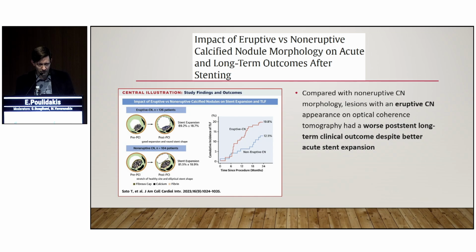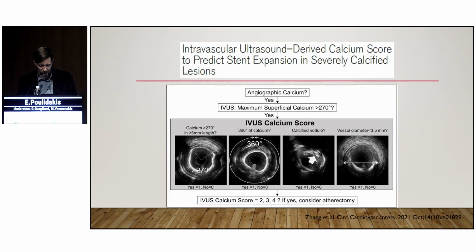Speaking about OCT, the OCT is the only modality that can discriminate between eruptive and non-eruptive calcific nodules, with eruptive having worse outcomes despite better acute stent expansion, mainly due to reprotrusion. So let's see also the IVUS-based scoring system.